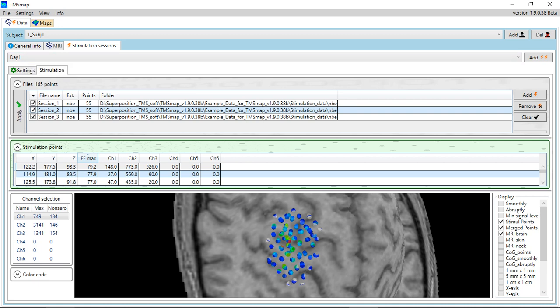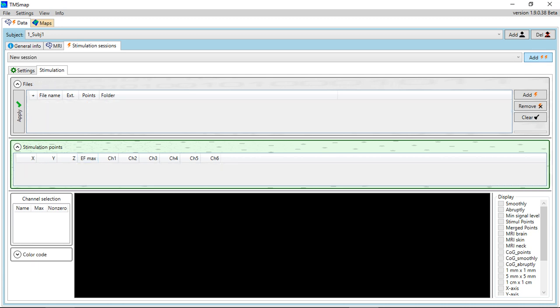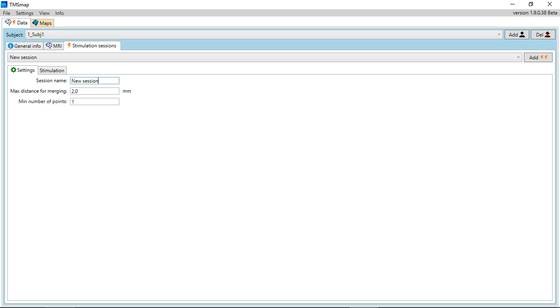So let's say it was day 1, and we want to show that we can do it with another session. So I add another one. It's a new session. I call it somehow differently. Day 1 Excel, I'll call it.